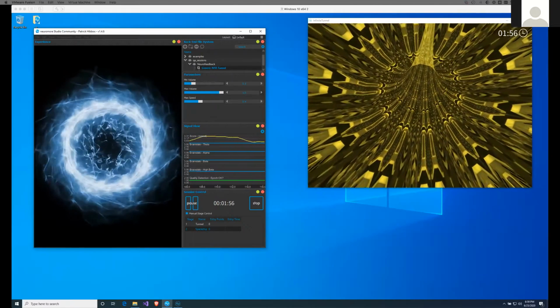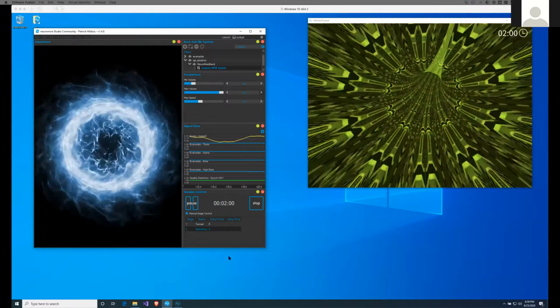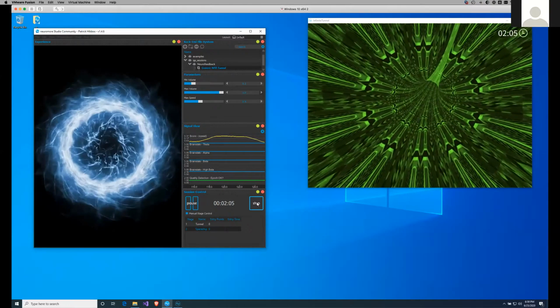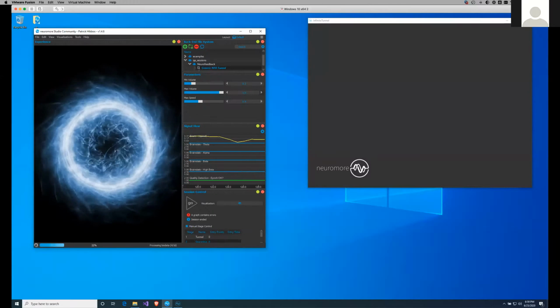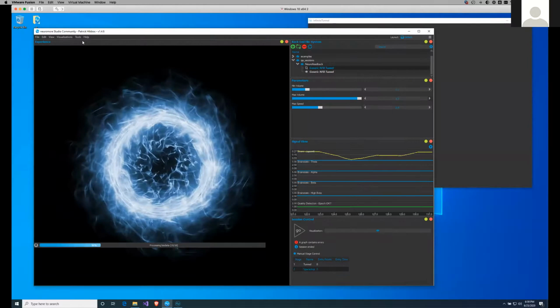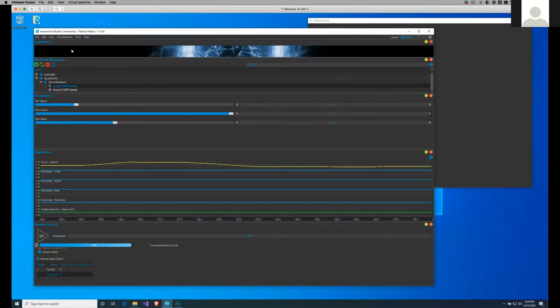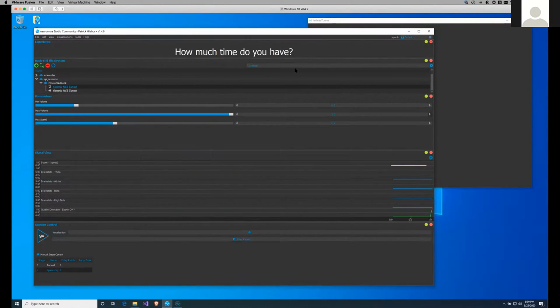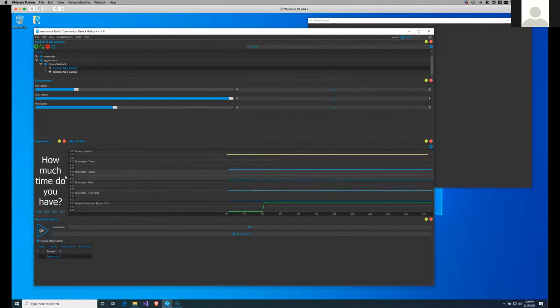And to debug, just in case anybody missed the state machine tutorial, you can actually see the signals inside the state machine transition from state to state. Oh, good point, Andy. I'm just going to show that because I think it also looks nice. There is nothing for you to do or not do. All right, just continue to keep your attention on. Let us move that experience window over here.